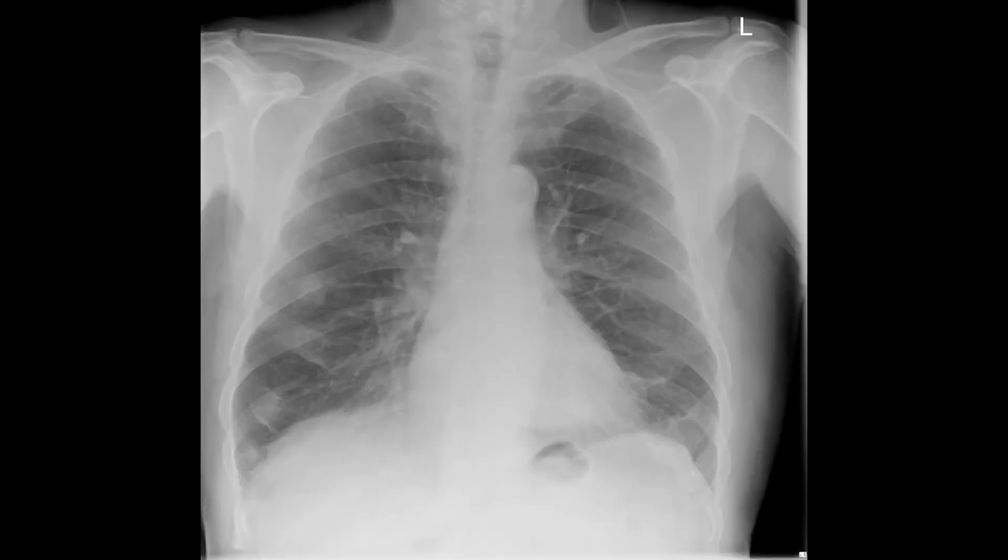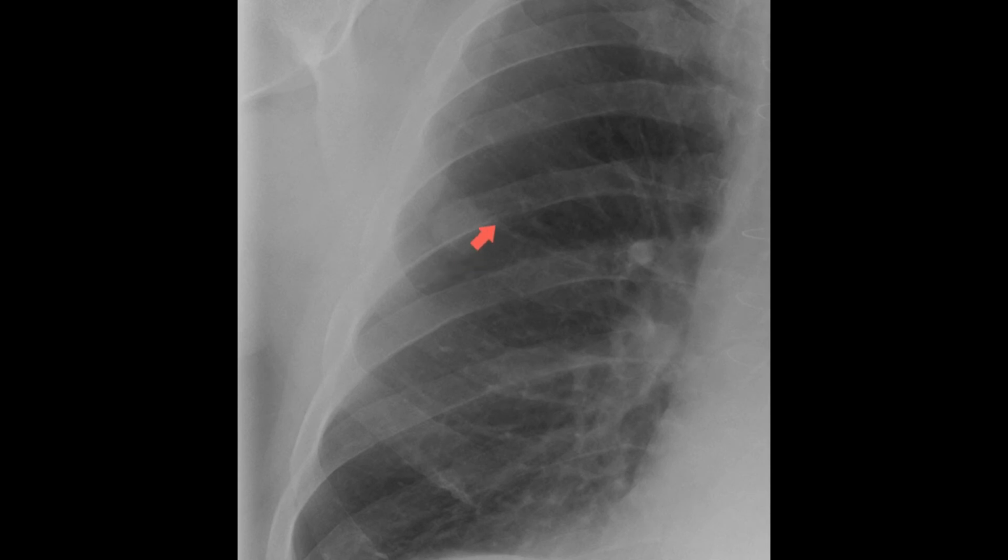Solitary lesions present a bit more difficulty. Here is a solitary nodule projected over the lung field. Now you can see that some of that lesion lies in the diamond, making it unlikely to be a bone lesion. But because it's a solitary lesion, I cannot be sure whether it's intrapulmonary or lying on the skin. Here is another patient with a lesion projected over the bone, but just a little bit of that lesion is projected in the diamond, making me think that this could be a lung lesion. But because it's solitary, I cannot be sure that it is not a skin lesion.